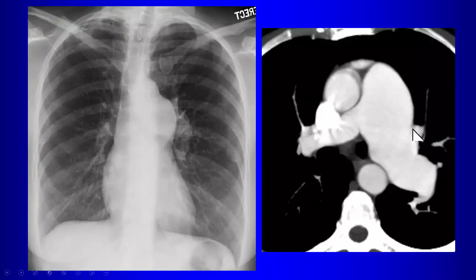And the reason this configuration occurs is that the poststenotic jet with pulmonary valvular stenosis results in enlargement of the main and the left pulmonary artery because the left pulmonary artery is continuous with the main pulmonary artery. The right pulmonary artery comes off at an angle, so the right pulmonary artery is not enlarged. So if you have enlargement of the main and the left pulmonary artery with a normal right pulmonary artery, we think of pulmonary valvular stenosis.